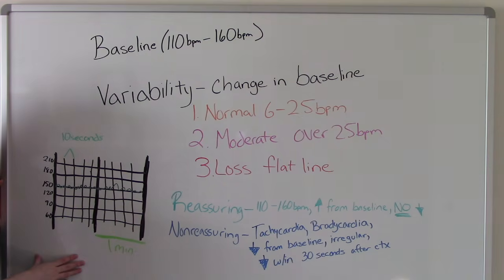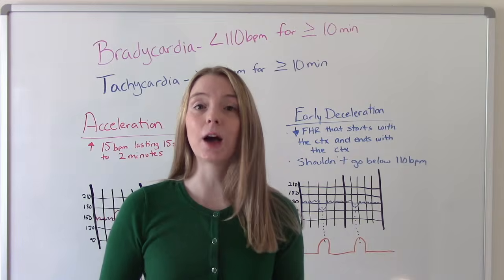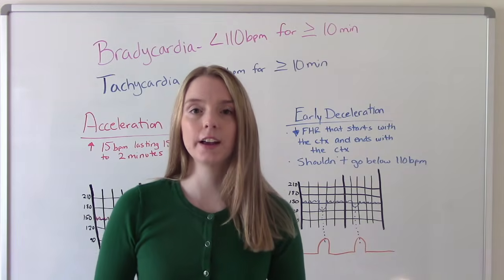And if you can tell, I tried to use the same color so you could tell, this is a reassuring pattern since we have our squiggle lines, right? We have variations from our baseline. That's a good thing. Okay, now let's talk about some variations.